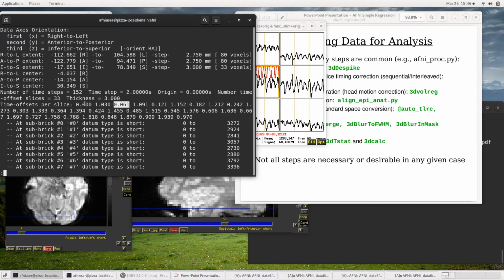So the actual acquisition is slice 0, slice 2, slice 4, up to slice, I guess this is slice 30 and 32, and then we come back. That's half a TR, we've gotten the even slices, then after half a TR, now we come back and start collecting the odd indices, slice 1, 3, 5, up to slice 31, slice index 31. And that's at almost 2 seconds.